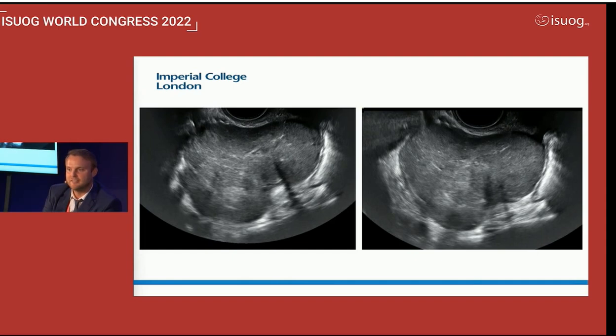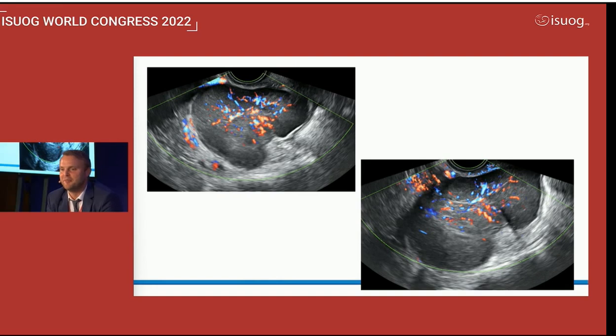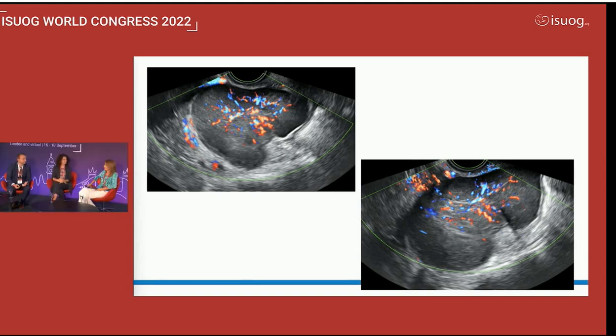Irregular lining, maybe. The vascularity. 4. Who thinks it's benign? Who thinks it's malignant? And now, would it be a granulosa cell tumor? No Swiss cheese. No Swiss cheese. A fibroma of the ovary.